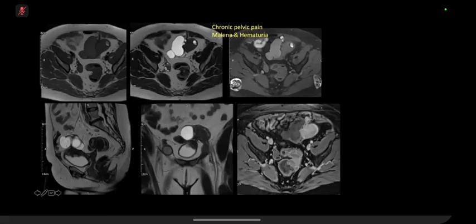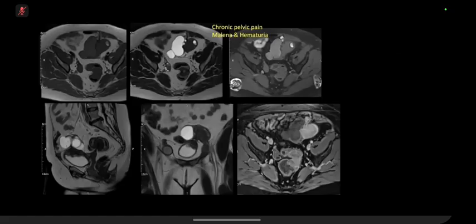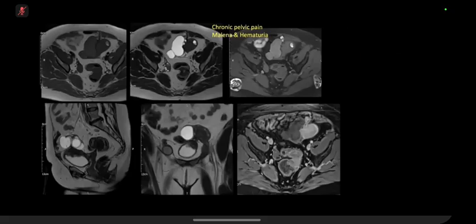Yes. Okay. And then on the lower sagittal slices, I can see there is abnormal hypointense signal arising. I'm wondering whether this patient had previous surgery. What surgery? Because I can see the vaginal vault. Whether they've had a hysterectomy? Yes, good. So the patient doesn't have a uterus. She has had a hysterectomy. And I can see the vaginal vault. But there is abnormal T2 signal projecting posteriorly, which is enveloping the urinary bladder posteriorly and extending through to the vaginal vault.